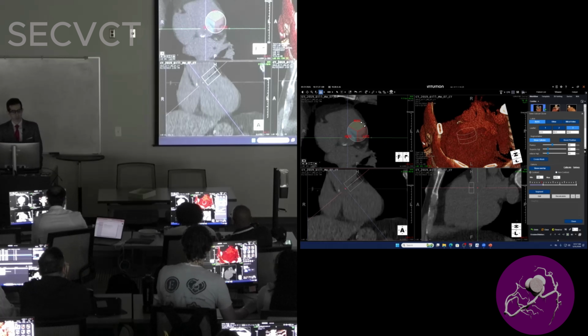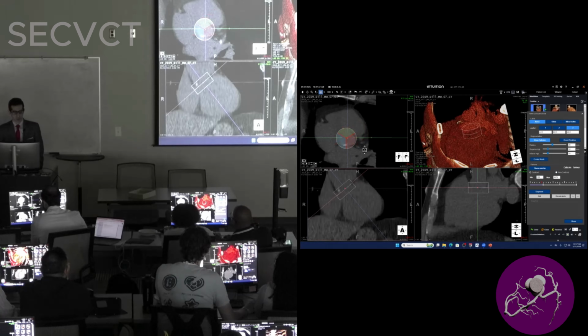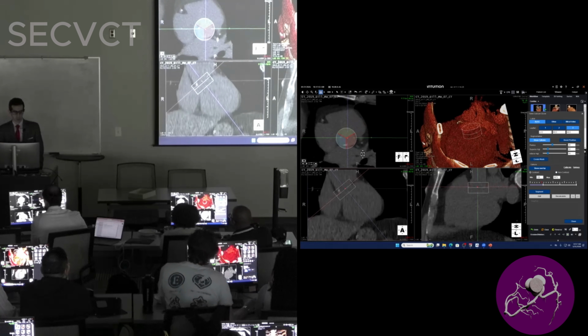From here, this is the circle that's supposed to be the aortic valve. You see how we are far? If you hover over the aortic valve circle for the calcium, you just carry it over the aortic valve. You start from there, and you start scrolling up and down, up and down. So let me just ask you here, are we happy with the circle?